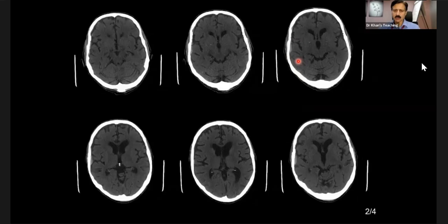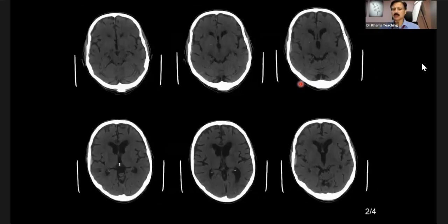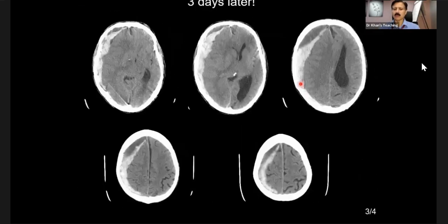I'll give you the windows shortly. And there is a subtle finding. What happens is the hematoma and the bone become conspicuous by different densities. On the regular window, it doesn't. I have seen over the last few years about 4 cases like this, which became big problems.